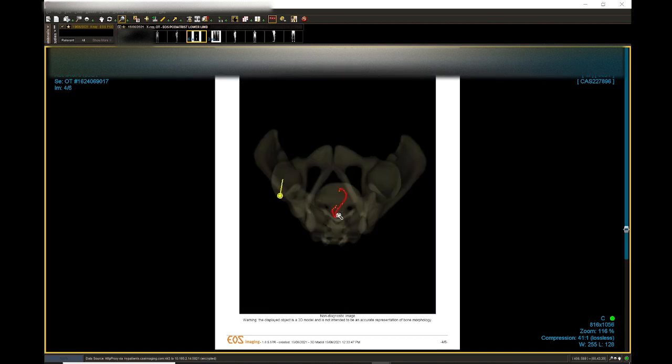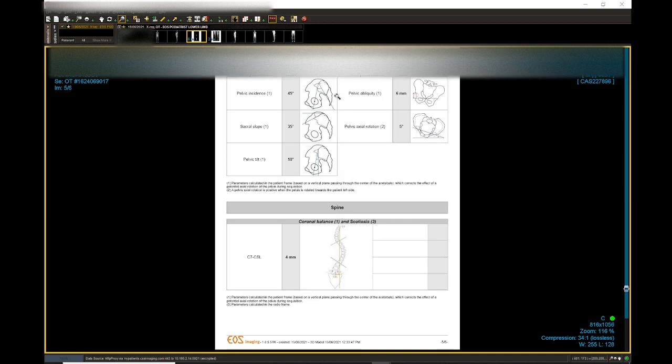All right. Also, most important, what we consider is pelvic tilt, because that shows us muscles that are attached to the leg, how much they're pulling down on the actual pelvis. So anterior pelvic tilt. So here we've got, say, 10 degrees of anterior pelvic tilt. All right, and what also helps is the inclination, right, of how much the pelvis is tilted. All right, so that gives us a little bit of information too. All right, so that's good information for us to have.